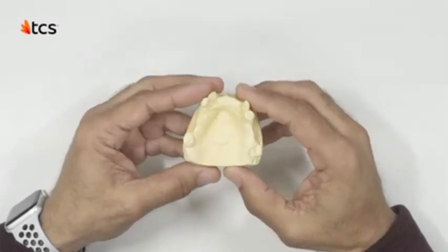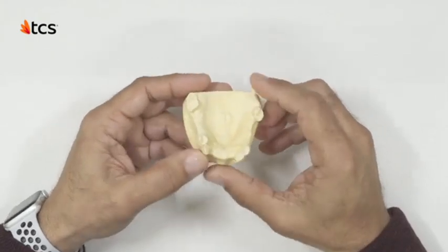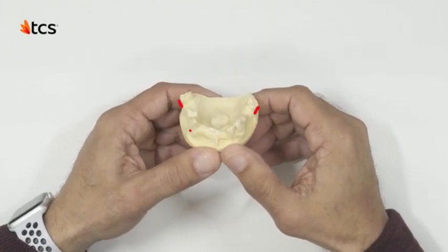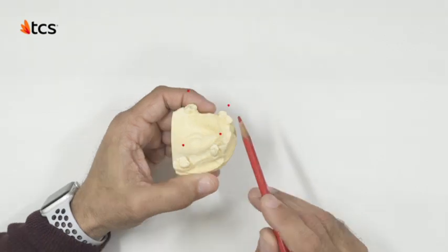Begin by assessing the design plan and amount of undercut needed for your case. As we evaluate this case, observe the angulation in these posterior teeth, this bicuspid, and this anterior tooth. These angulations will present difficulty for the path of insertion. Our main challenge will be to get over these high points while maintaining an aesthetic and functional design.